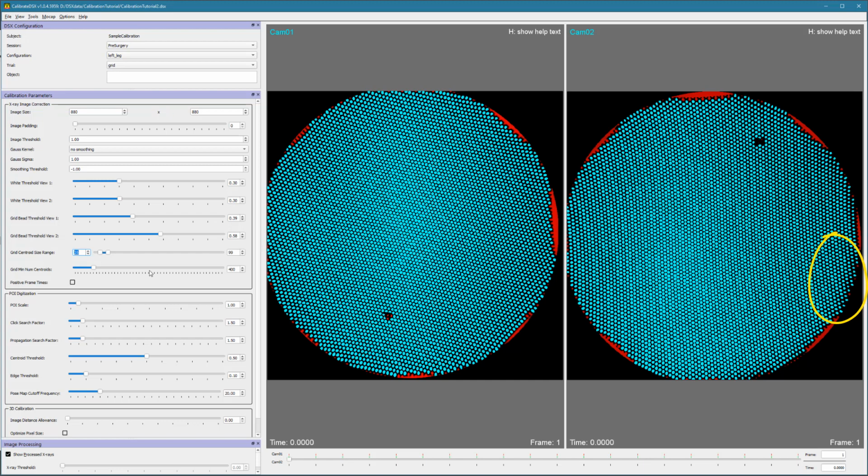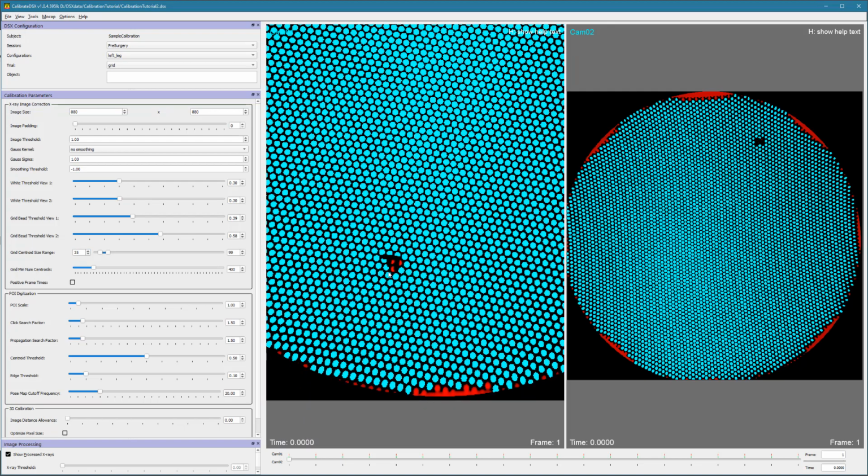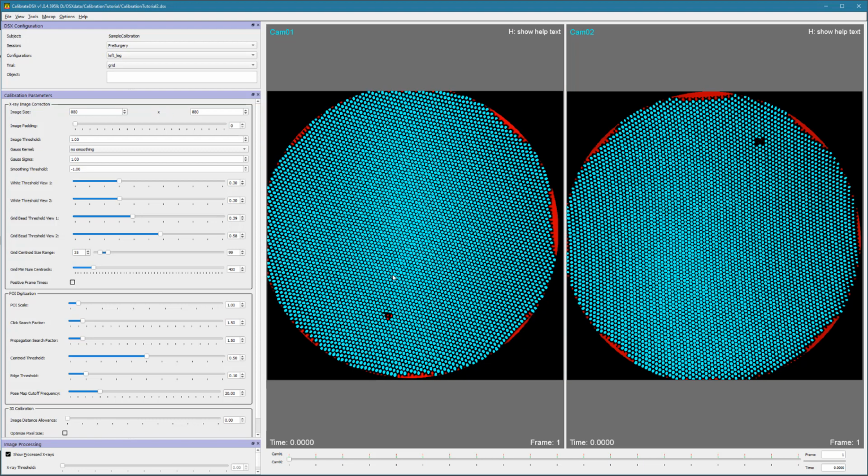In any case, if the bones you'll be tracking are not in these regions with the partial grid holes, then it's probably not important which ones you include or exclude. This region here is not a concern. If a missing grid hole has at least 2 valid neighbors, then its position can be interpolated, so all 3 of these missing ones will be filled in when the displacement map is created from the grid of holes.